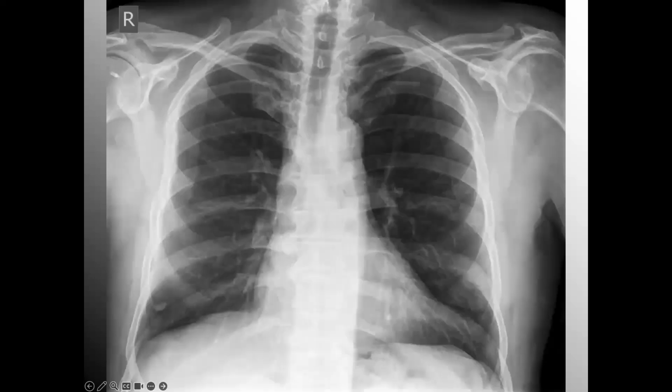So here we've got another patient. If you start with your systematic approach, the airway's midline, I don't see any obvious fractures, breaks, fissures of the bone, or dislocations. One thing I do notice, and I'll come back to, is when we get to cardiac, I can see my right anterior border. I can see my left anterior, but there's something a little unusual right in here.